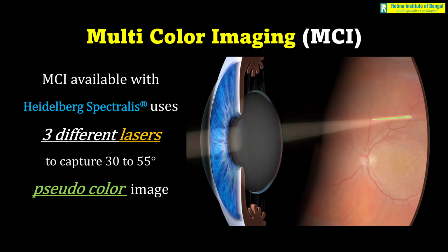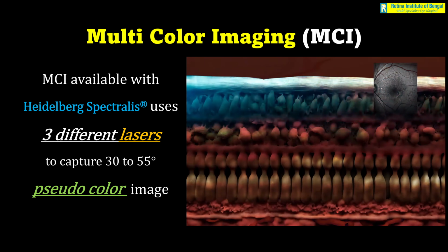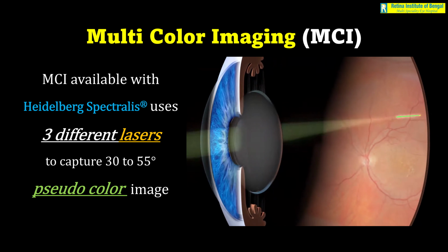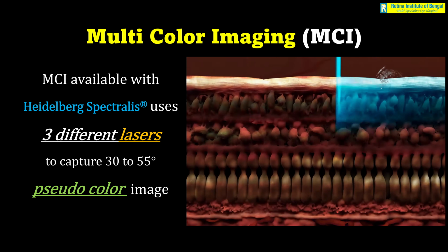So it is a confocal scanning laser ophthalmoscopy based system using three different lasers, each penetrating to a different level into the retina. Then the reflectance images created by these three different lasers are combined to create the pseudo color multicolor image.